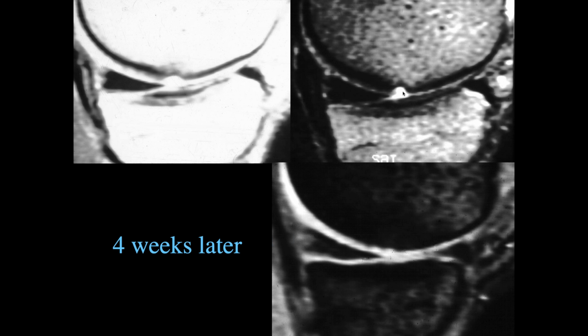They definitely need to be followed. In the beginning, when he had the initial injury, he should have been placed non-weight bearing at that time since he did have the subchondral injury. And since the surface is so irregular, there's also risk for surrounding progressive full thickness chondral loss and worsening degenerative disease.